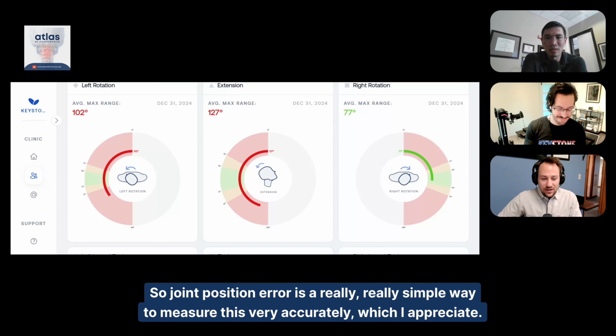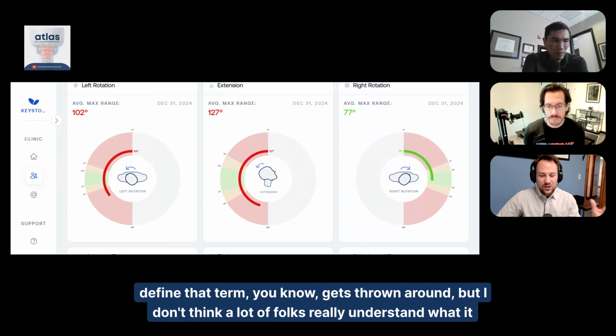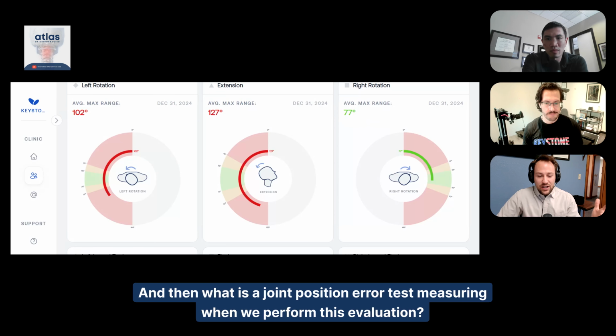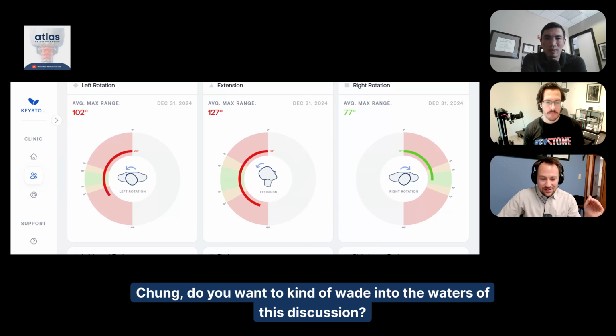So joint position error is a really simple way to measure this very accurately, which I appreciate. I think it'd be first important to understand what proprioception is generally. If we were to define that term, it gets thrown around, but I don't think a lot of folks really understand what it means. What does joint position sense have to do with proprioception? And what is a joint position error test measuring when we perform this evaluation? So, Dr. Chung, do you want to wade into the waters of this discussion?